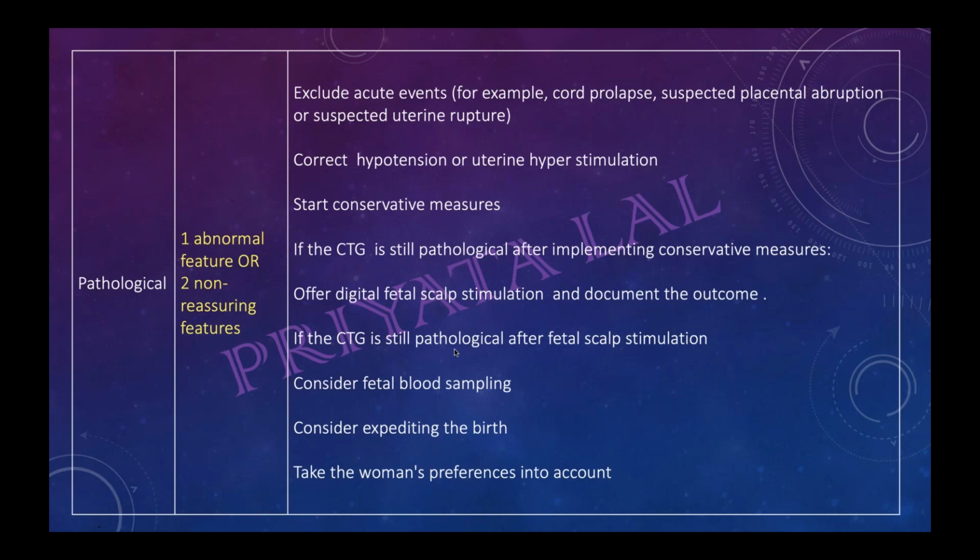Yes, you are right. This CTG table that we are reading today has changed. It has newly come in 2017. It is updated. Previously, fetal scalp stimulation was not there. It has been added after 2017.